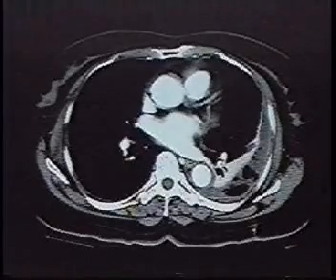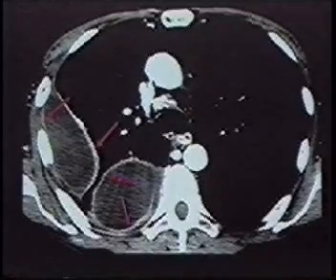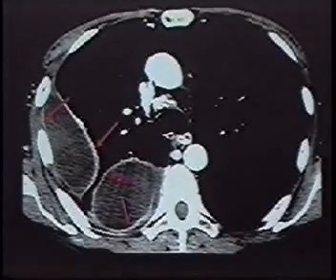This is an example of an empyema with a lenticular shape, thickening and enhancement of the pleura, and infiltration of the extrapleural fat. The air in the collection is from a recent chest tube placement. Another example of empyemas shows the lenticular configuration with thickening and enhancement of the two layers of the pleura, or the split pleura sign, and a non-dependent location for the more lateral collection.